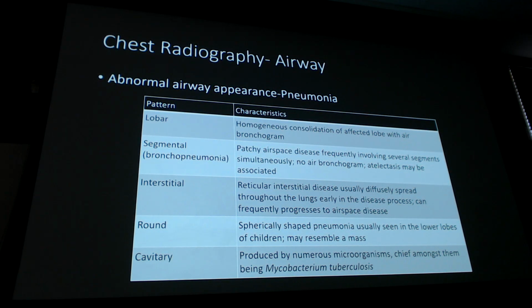Okay. We're going to go over the pictures, okay? But here's a worded chart for those who like to read the descriptors instead of just looking at the pictures to help you get a better understanding. All right, I'm not going to read that to you. That's for you if you want to use it that way. But we're going to hit a lot of these in the pictures right here.